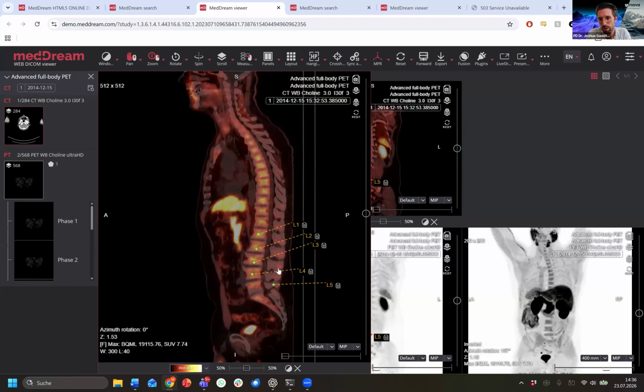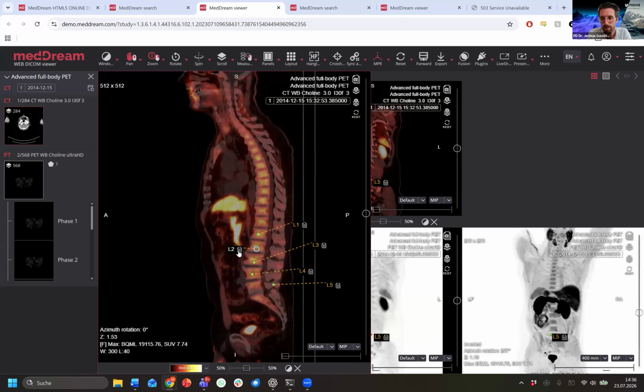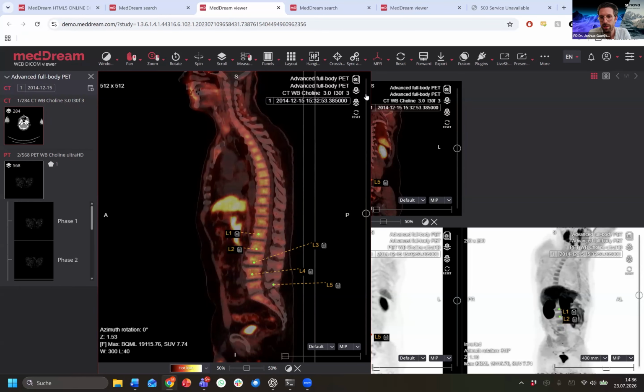I think we could talk in the future about something to put the label in front rather than in the back. Something you could definitely think about. But honestly, if you have an MS case and you know you definitely want to do the labeling, I would just use the posterior process as an area of confinement.